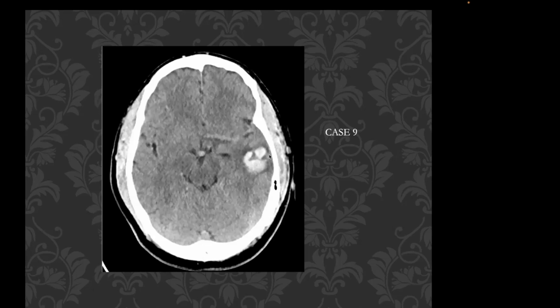The point I want to make in this patient is that this is a young patient with a lobar hemorrhage, with no history that would help you. And we assume that the CTA showed no venous occlusion either, because vein of Labbé occlusions can present as lateral temporal lobe hemorrhages. But if the CTA is negative, you really should go on to DSA, because small arteriovenous malformations may not be visible on the CTA, because CTA is not sensitive to the timing of venous opacification. So this patient actually turned out to have an arteriovenous malformation.